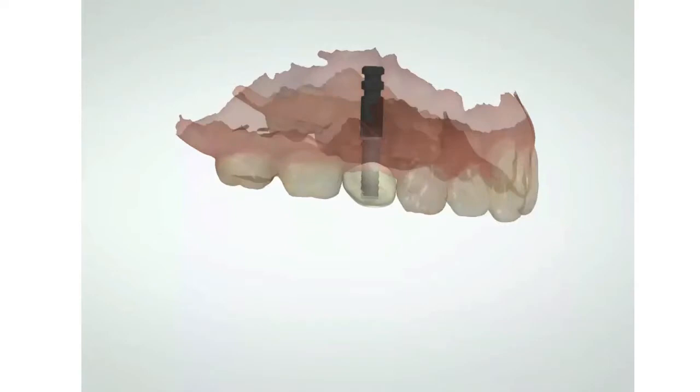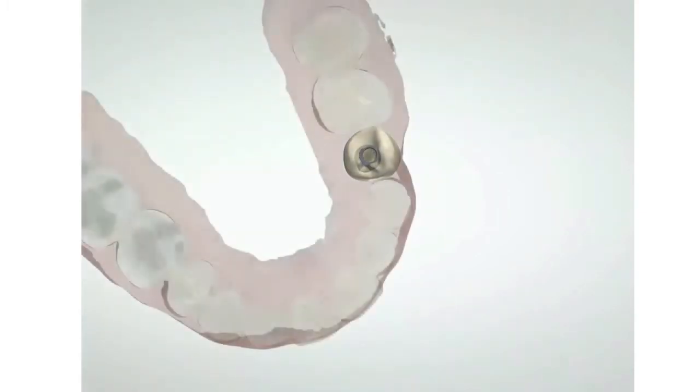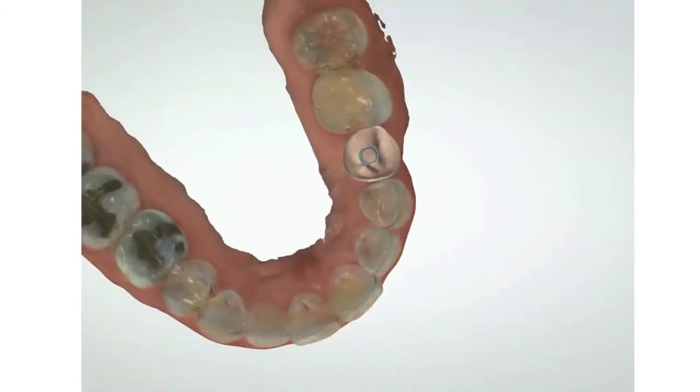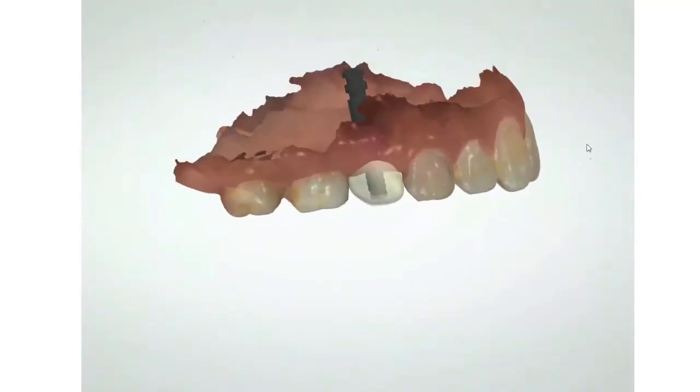So we're going to do this as a screw-retained restoration. And the provisional component, that screw-retained titanium cylinder, comes from the libraries that Paltop has embedded into the planning software. So within the planning software systems, 3Shape, the major one used in the United States, or Exocad or Dental Wings, are these libraries.